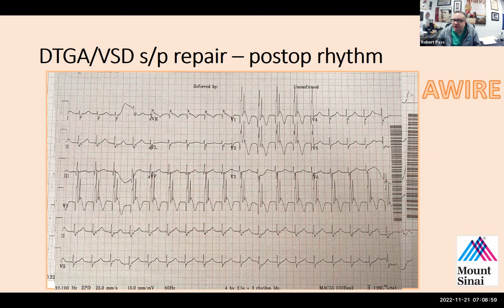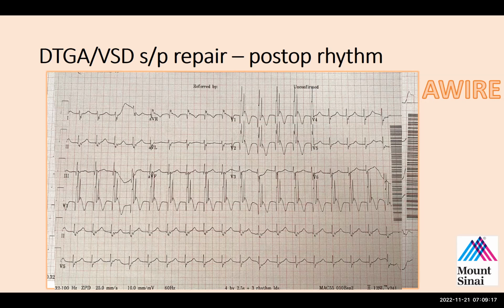So here is, in fact, the A wire of this patient. Has this confirmed the diagnosis that you just made, which was junctional with 1-to-1 retrograde P waves? Yes, I believe so, because I think the atrial EKG was connected to the V1 and V2. Yes, so that's right.